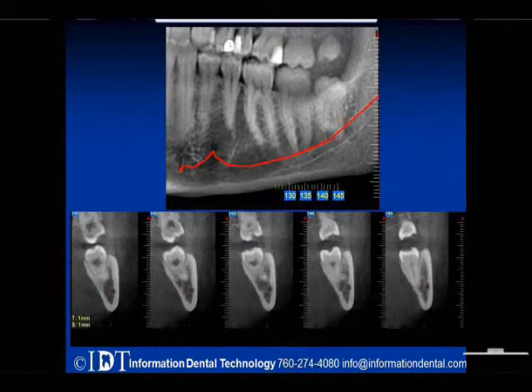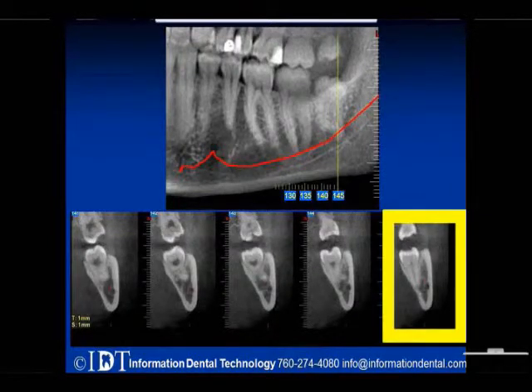So we took a CT, and the top layer is a pano. It's a 12 millimeter thick cut pano. So we're seeing all of the anatomy on the mandibular arch right there. And you'll notice the tick 145 at the bottom; we're going to follow that line all the way up. You'll notice that it slices straight through that distal root. So just like the loaf of bread, we're going to pull that slice out and lay it flat. And that's what we're seeing here.